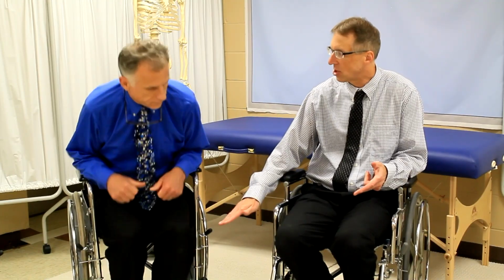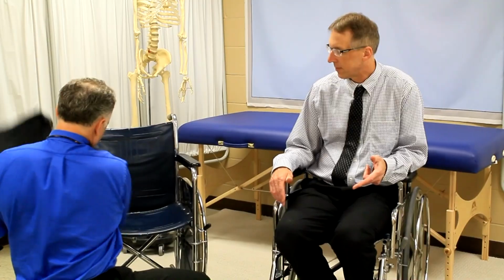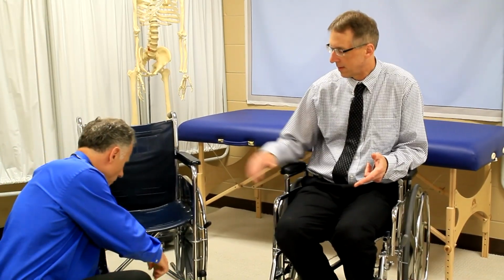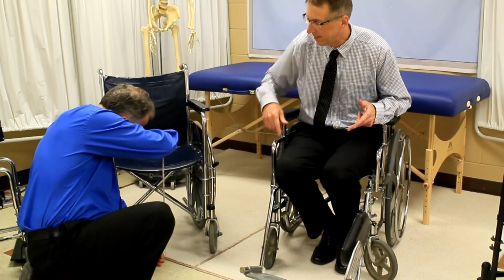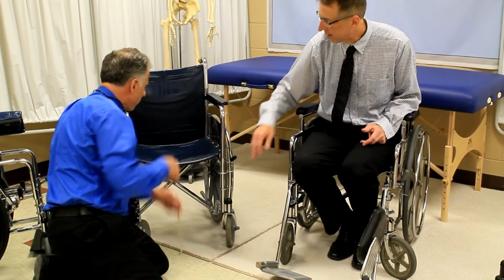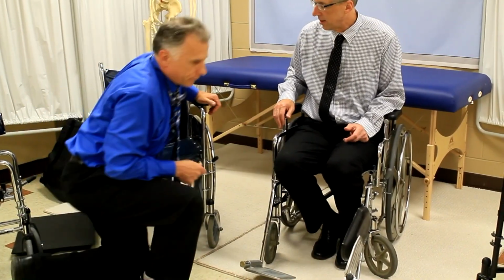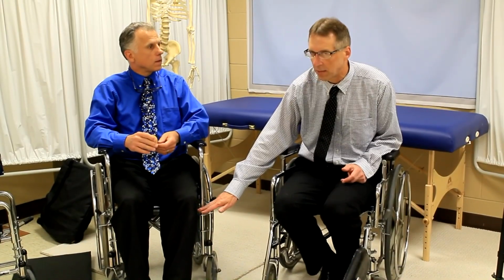All right, height of the chair. Again, on a standard chair, and we'll talk about the different types of chairs next, usually the height is like 19 inches. So, Brad's got his tape measure. I'm going to take these cushions out. You're going to measure from the floor right to the seat. There's 19 inches from the floor to the sling. So 19 inches is a standard chair, 17 inch would be a little bit of a lower chair.